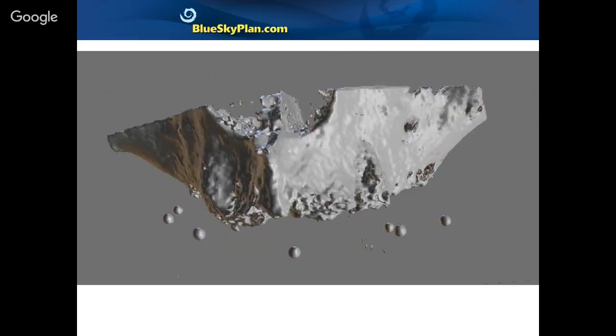When we scan the patient wearing the denture and the markers, we're going to get a CT scan that looks something like this. The denture itself is radiolucent, so when it's scanned together with the patient, it's not showing up. But the markers and the patient's anatomy are showing up in the CT scan.